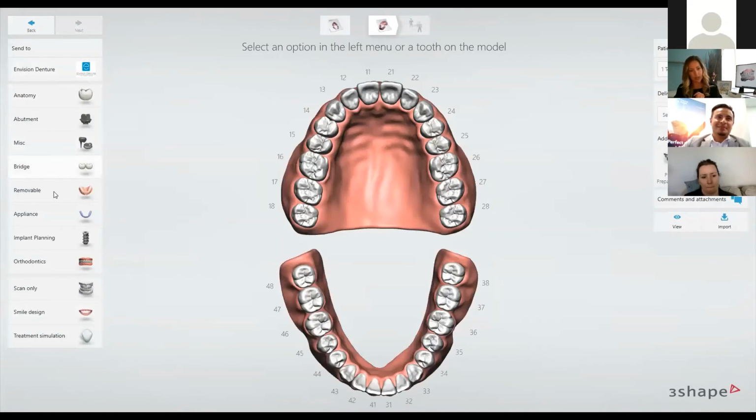And you can see on the top left here, we've got... can you see my screen okay, Eric? Yeah, I see everything. It's perfect. Yeah. Obviously, lots of options. You know, I'm not doing abutments, I'm not doing crowns, we're denture specific.